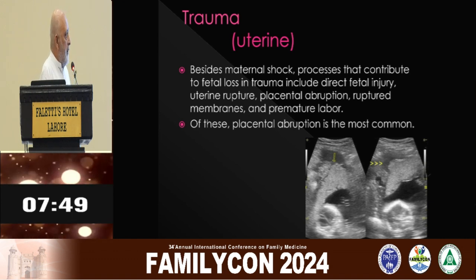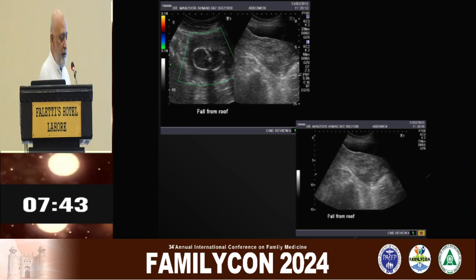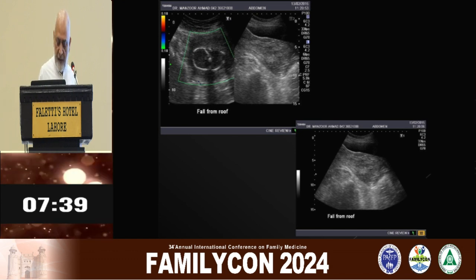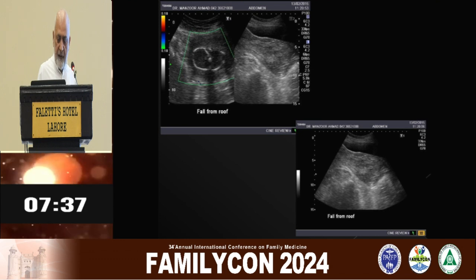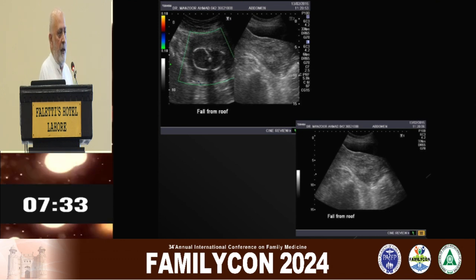And here is a case where there is a lot of hemorrhage inside. The baby is dead and there is a history of trauma, direct trauma or direct fetal injury, causing the intrauterine fetal demise as well as the pain plus vaginal bleeding.